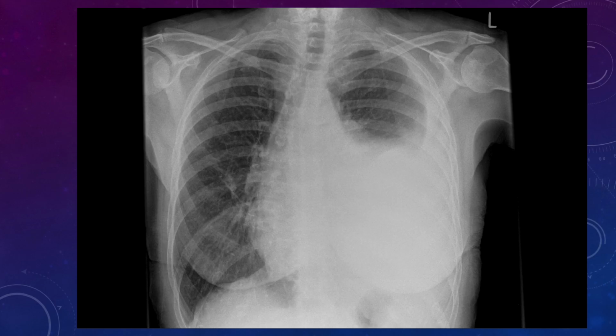In terms of densities of the chest, so talking to you about how the mediastinal structures will move. If you get consolidation, you get collapse of a lung, then that will pull the trachea towards the side that's collapsed because you're losing volume and the trachea will move. This is a patient with a large pleural effusion. And this pleural effusion is tracking up the lateral chest wall, probably almost to the apex on this AP film. So there's many, many litres of fluid within here. If you want to lose a costophrenic angle, you're looking at a couple of 100 mils of fluid. You want to opacify a whole hemithorax, it's litres of fluid to do that.